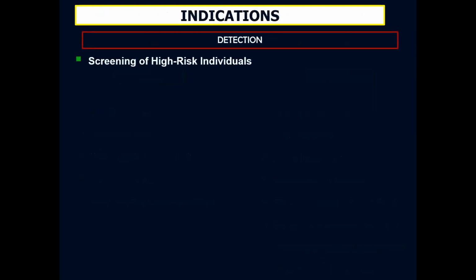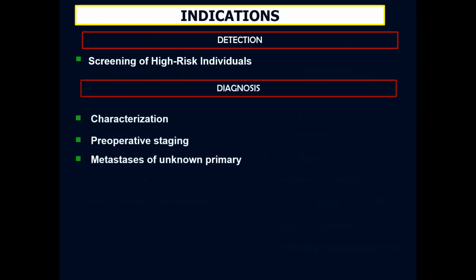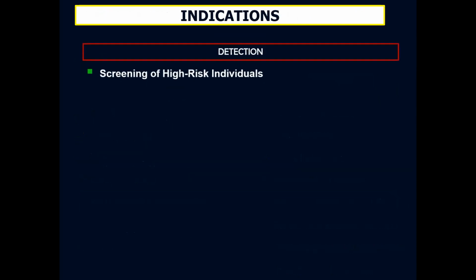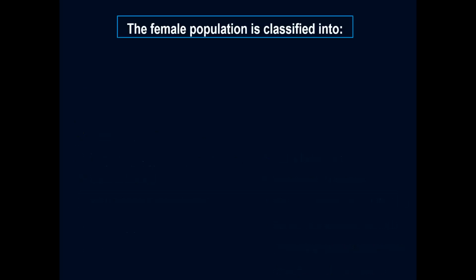They are both indicated in detection, or what we call screening, and when lesions are identified, they are indicated to characterize these lesions and to preoperatively stage these lesions, and they are also indicated in the follow-up of treated breast lesions. And we'll start by having a look at detection.